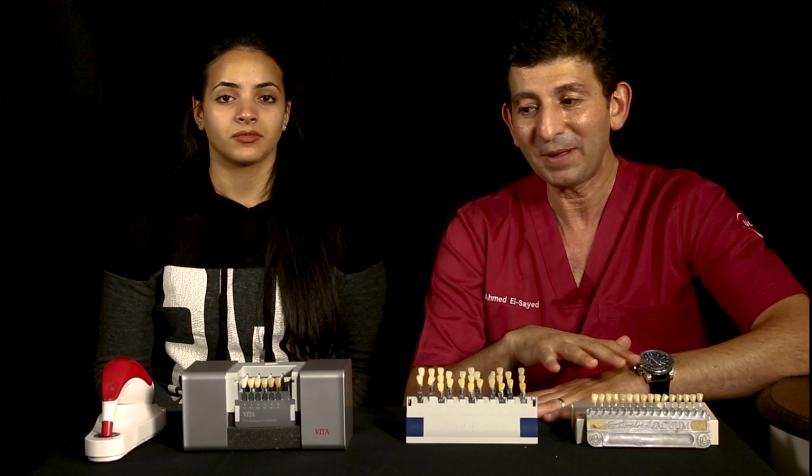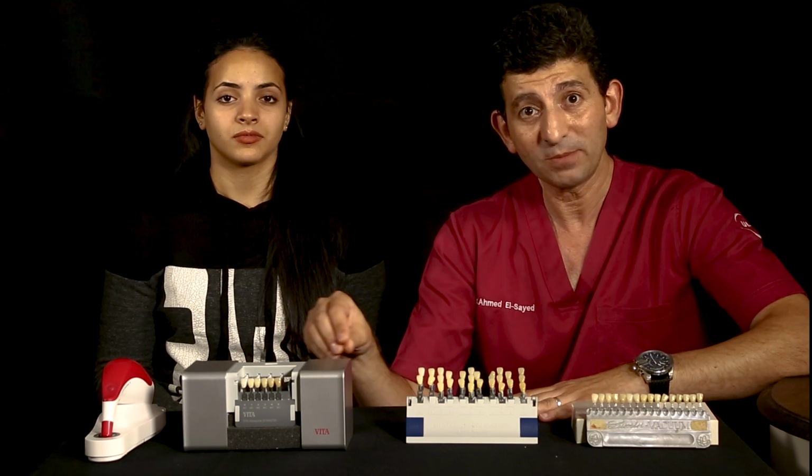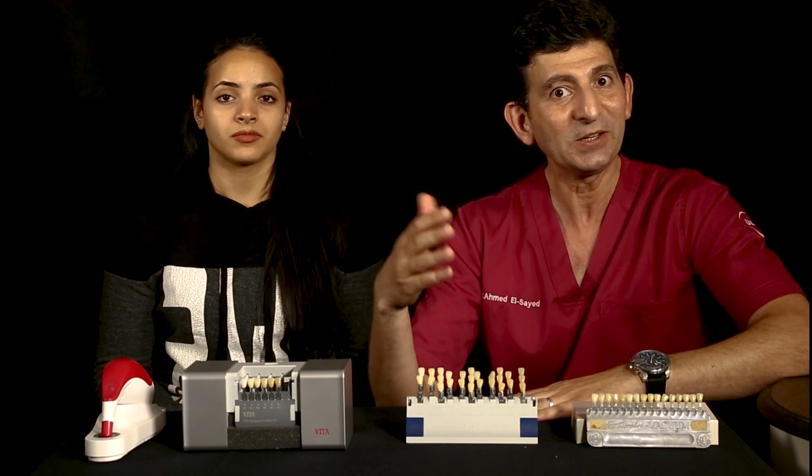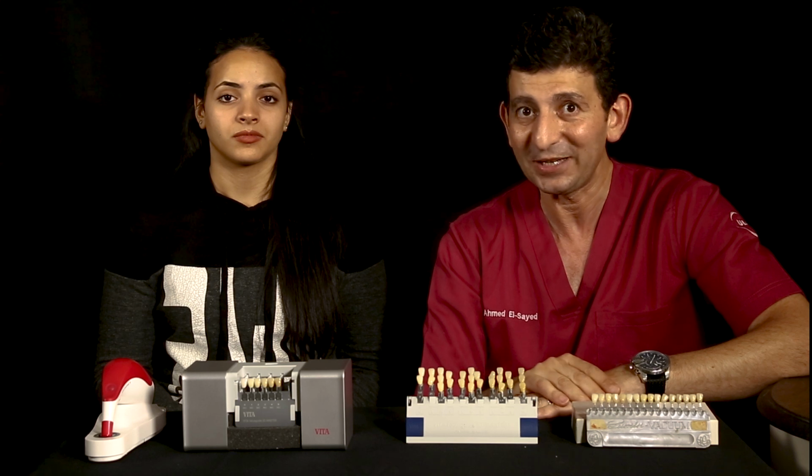So today we talked about the most common shade guide systems that we use in our clinics. In the coming series, we will talk about more details about each one.